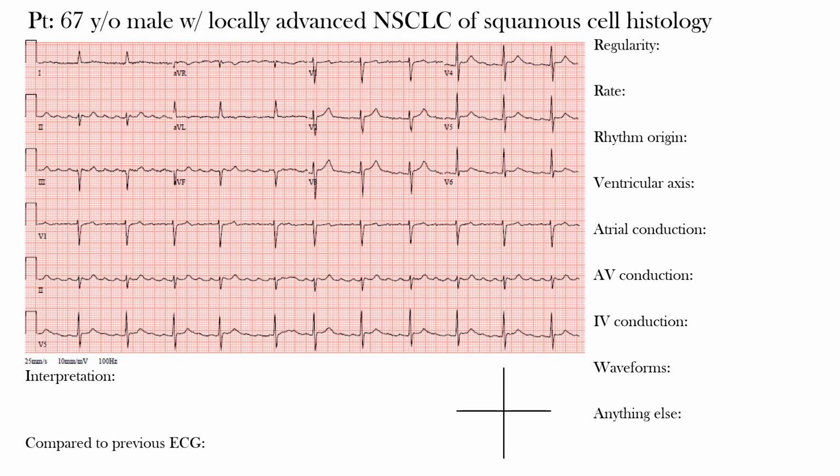So this week's case is a 67-year-old male with locally advanced non-small cell lung cancer of squamous cell histology. His presenting EKG is shown here.